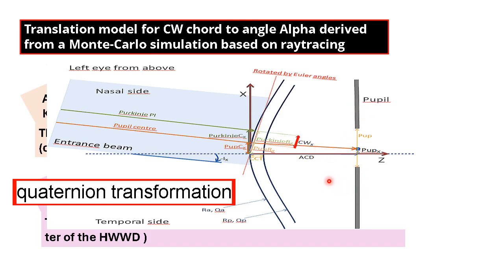This is the point. You'll find this term repeated, and you might not understand the meaning of chord mu. Chord mu is a polar representation of the angle of kappa. Most doctors are using this calculation because it is more accurate in measuring the angle of kappa than the old traditional way of measurement. So I would like to speak about this so that you will be familiar with it when you face it in the Pentacam printout.